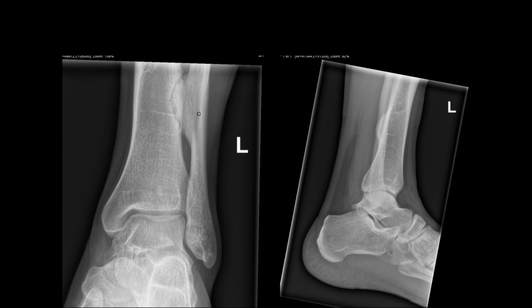So based on this, what do we infer? Based on the above abnormality, the findings are most likely to represent a benign bone lesion, likely to be long-standing. The findings are most likely to represent, or are characteristic of, a sessile osteochondroma. Differential would include sequelae to previous trauma, resulting in heterotopic ossification or new bone formation along the fibula or interosseous membrane. Subsequent MRI was performed and proved it to be a sessile osteochondroma.